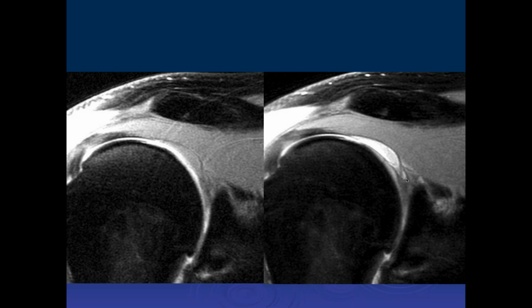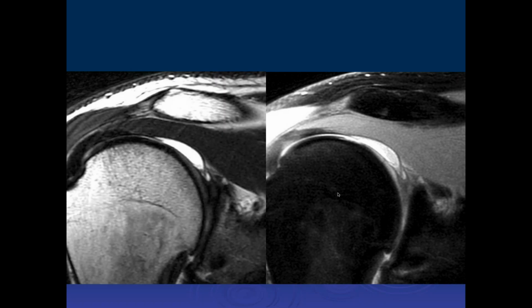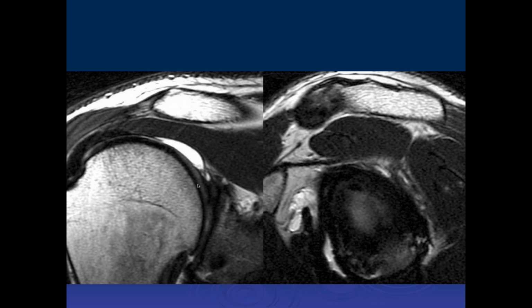Okay. We don't see a good labrum here. It's definitely abnormal, like you say. But what's all this fluid here? This is an arthrogram on the T1 fat suppressed. This is not bright. On the PD fat suppressed, it's bright. It's kind of far from where I expect to see a paralabral cyst. So here's a T2 image of it. Okay, here it's extending from the labrum, I guess. Okay, it could be an intra-articular paralabral cyst.